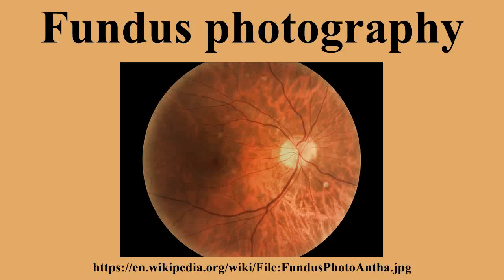When the button is pressed to take a picture, a mirror interrupts the path of the illumination system, allowing the light from the flash bulb to pass into the eye. Simultaneously, a mirror falls in front of the observation telescope, which redirects the light onto the capturing medium, whether it is film or a digital CCD. Because of the eye's tendency to accommodate while looking through a telescope, it is imperative that the exiting vergence is parallel in order for an in-focus image to be formed on the capturing medium.